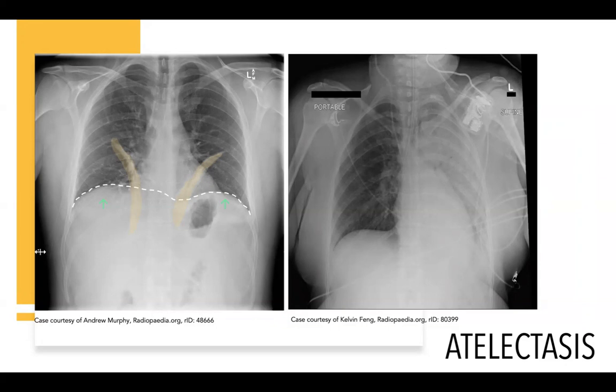On the right is a 45-year-old female scheduled to undergo an elective procedure. The patient developed bradycardia and hypotension after anesthesia induction. Airway pressures increase progressively with concurrent decreases in pulse oximetry values. This patient coded, and this is the post-resuscitation chest X-ray taken upon admission to the ICU.